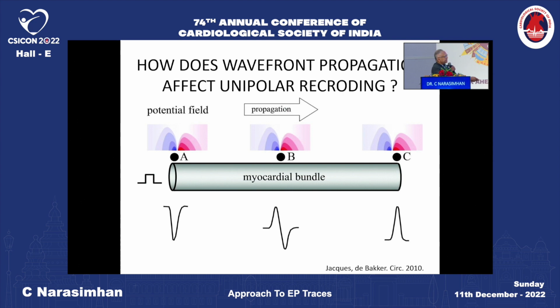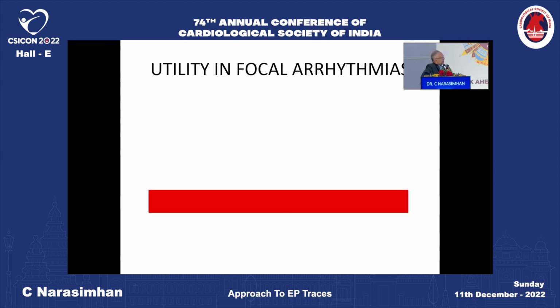Now this is the intrinsicoid or intrinsic deflection, where it crosses just till this point B, the electrode keeps coming, the charges keep coming here. It crosses the baseline and moves to the other side. This is a baseline crossing where exactly at that side it becomes a biphasic kind of wave where it crosses the point of recording.